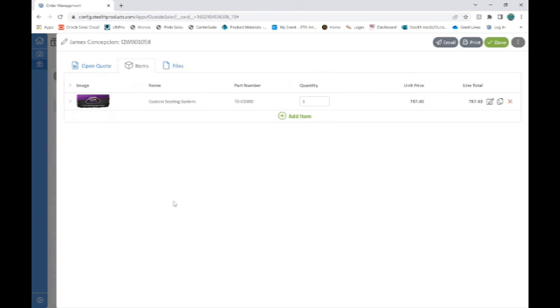So for you providers out there speccing it, make sure you save that information. Some of your most common things, you can set it up for peds in the old school planer systems. You can set it up for your standard adult, maybe in a skilled facility, but you can have as many as you like.